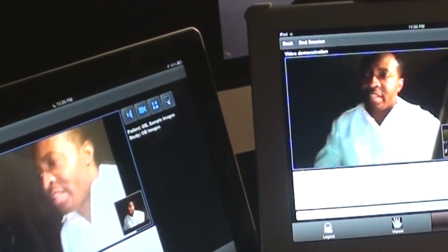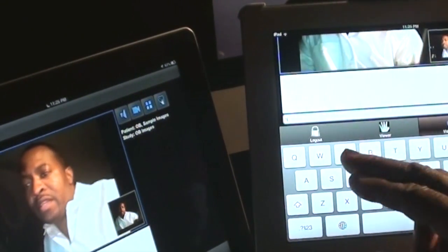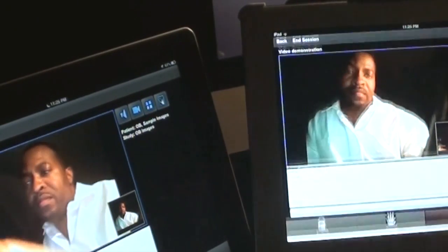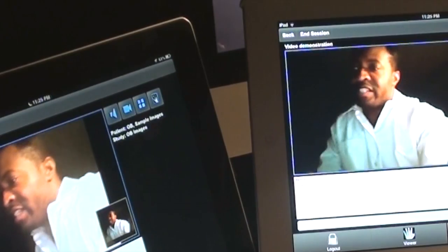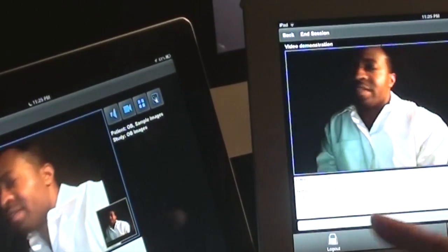Now, let's start. Let's chat. Hello. Did you see? There we go. You can see the response. And I can send a response back, or hi. Send that back. There we go.